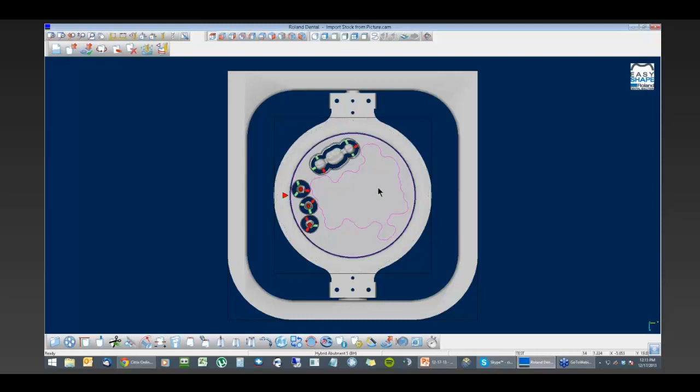So that's another trick. When you're taking a picture of the disk, you want to get the picture of the disk in the orientation in which it's going to sit inside the machine. If it pulls in sideways like it does here, we also have the option of rotating the disk, which is this button right down here where it says rotation of the blank. Once we click on it, we'll get a dotted line that comes right down through the middle and also across through the disk.